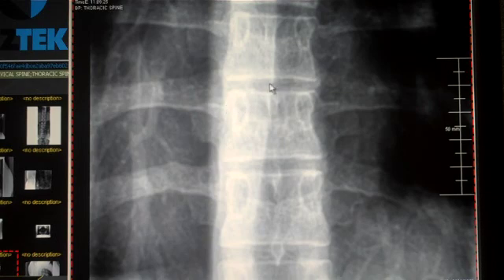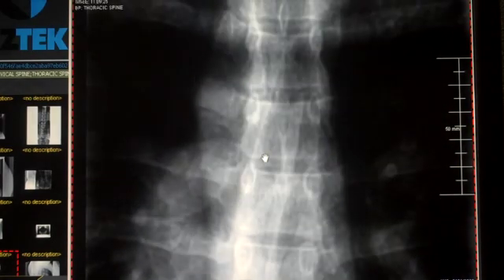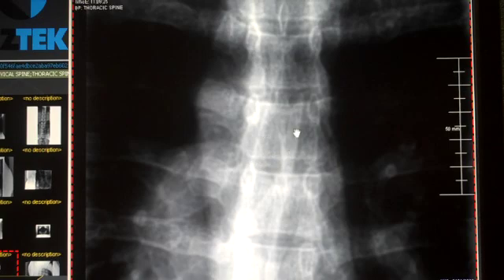Now you notice that from right here out to here, it is whiter than it is on this side of the segment, and that's because all of this is the aorta. The aorta comes down along this one side and continues on down. This density change that is right along right here, going all the way up, is called the paraspinal line. Basically we're looking at airspace inside the lung field versus soft tissue and fluid outside the lung field. We can see some of the pulmonary vessels right here, and as I pull this down so that you can see up into this area, we see the aorta again across right here.